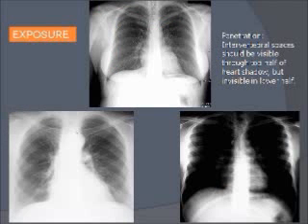Now coming to the exposure, as I told you, there are many factors while taking X-rays, like kV and mAs. The end result should be a properly exposed film. The film should not be underexposed or overexposed. In the bottom row, the first image is an underexposed film: the heart is whitish and the lung vessels are prominent. In the other film, all the lung is dark and you cannot make out details. That one is an overexposed film. But the top row image is a properly exposed film.